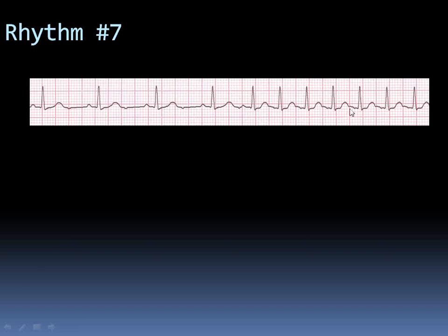So you have to look at the ECG tracing. You have to see how fast it is, how regular it is, and if you can make a P wave before every QRS. If the answer is no, most likely it is supraventricular tachycardia. Now remember, it is about pattern recognition also. Okay?